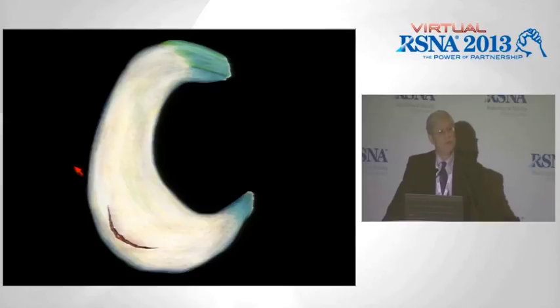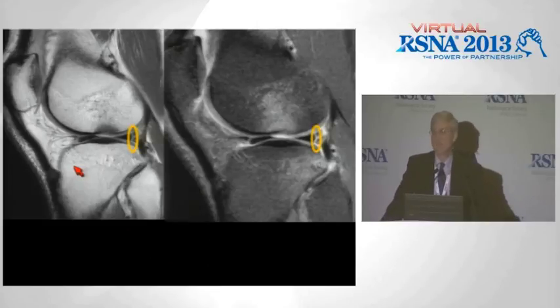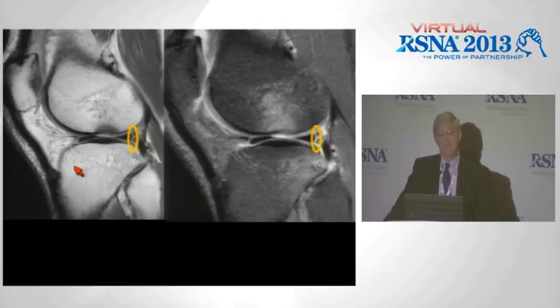When we have peripheral vertical longitudinal tears, those again may be in the vascularized portion of the meniscus. They may have an ability to heal on their own. So here is an example of that, and the example we looked at as well. Probably the first 3 or 4 of these I saw 2 or 3 years ago, I missed. What I often like to say is they were seeing me, I wasn't seeing them. And these are important to identify. And the problem is when they occur posterolaterally is, why isn't that just fluid along the popliteus? Right? Why isn't it just fluid?